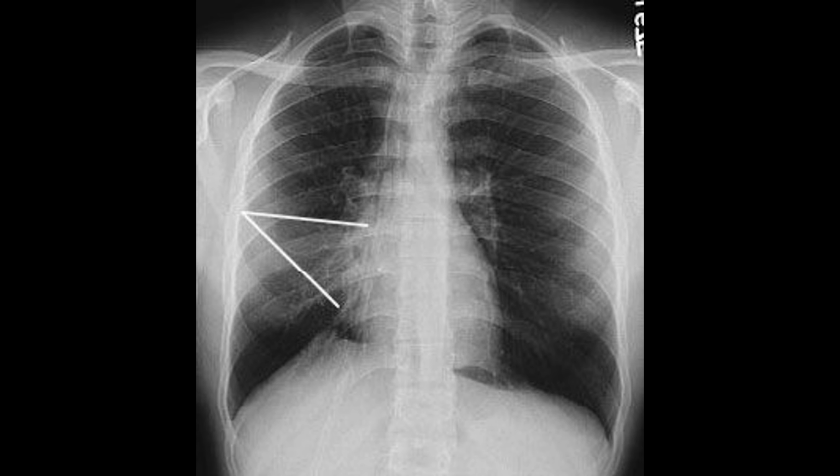The main differential diagnosis on the chest radiograph is right middle lobe consolidation due to pneumonia, but in this case, the clear evidence of volume loss, demonstrated by hemidiaphragm elevation and fissural displacement, supports collapse rather than infection.